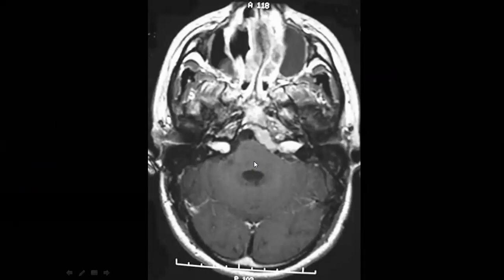So let's continue our review in neuroradiology, and we try to fix some issues in the exam. What is the most important to check? Okay, so let's have a look at this case. This is one of the most important cases that you can check in the exam. Differential diagnosis again.